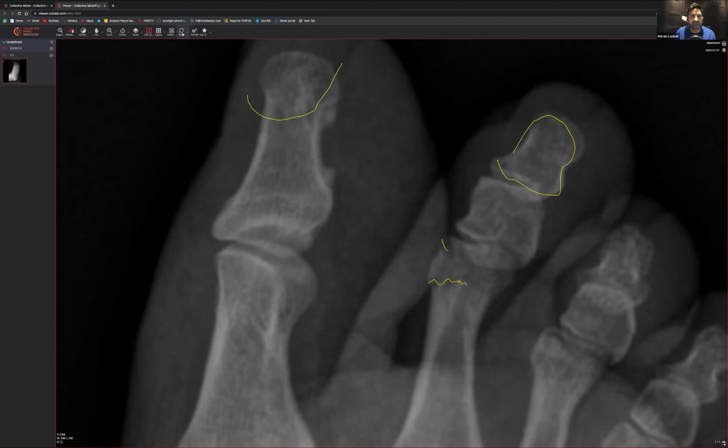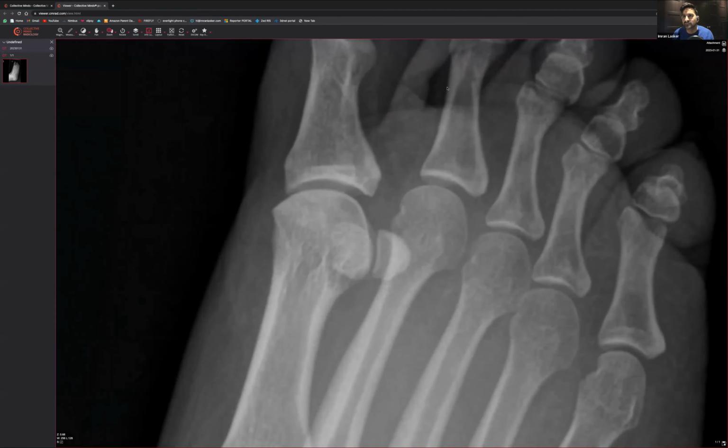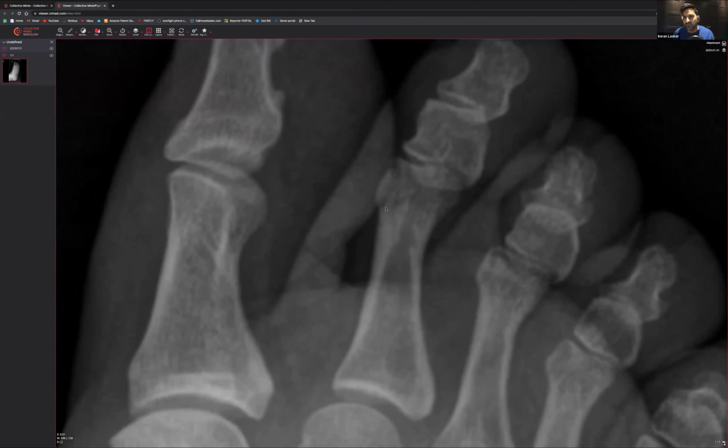Okay, let's have a look. So reset all. That doesn't look quite right. So that doesn't seem right to me. Can everyone see that? So if we zoom in. I'm glad some people are really on it today. That doesn't look quite right to me. Looks like there's a bit of a discrepancy there. Looks like there could be a fracture there within that neck.